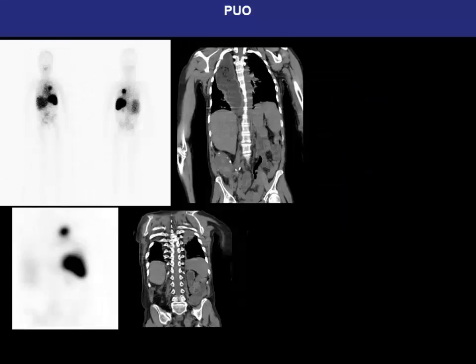Another patient who had a renal transplant, and the question was whether this patient has got a rejection or infection of the transplant. And also this patient also had what is called a gastric pull-up surgery, so they do it for the procedure. And when we did the white cell scan, there was a focal uptake in the lung.